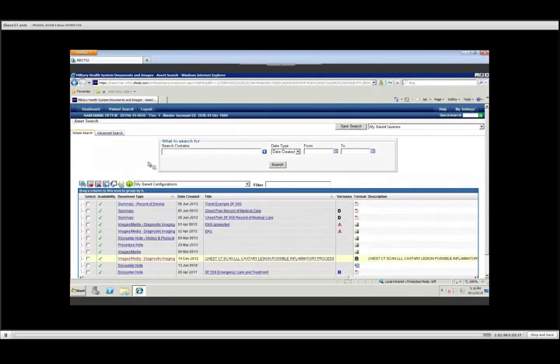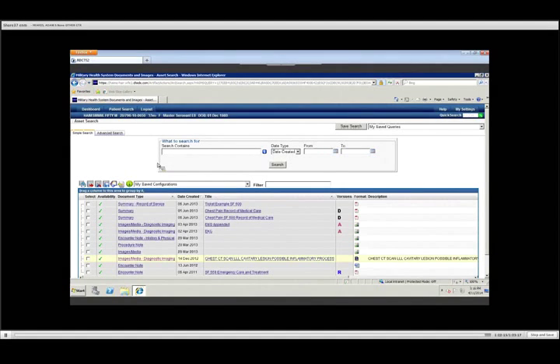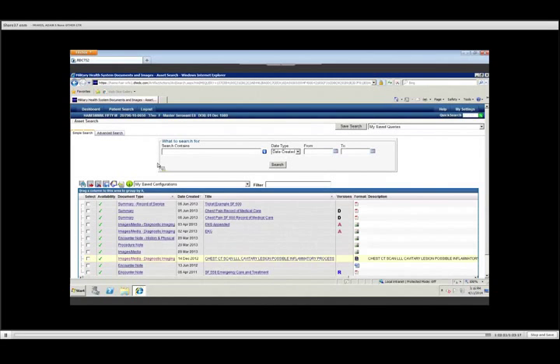Sir, I have another question for you. Okay. How far back are they importing these x-rays? Like, could I look at an x-ray that was taken in 2000? Good question. Student wants to know how far back can we access these radiographs in the HAIMS application. They do not go back beyond March of 2012.